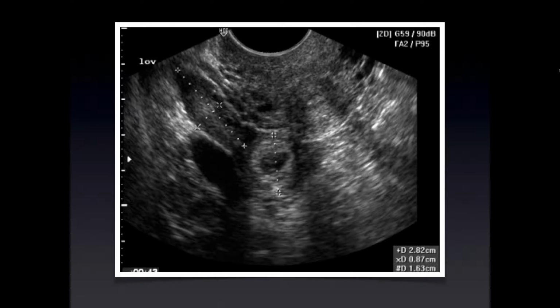Case 14. This is just a case from the literature, just a published tubal ring next to an ovary. Again, just giving you a good idea of what this looks like. We have the uterus here, the iliac vessels here, and then the ovaries and tubal rings are sandwiched just between those two. So again, in coronal plane, it's really useful to very carefully survey that 45-degree angle between the uterus and the iliacs.